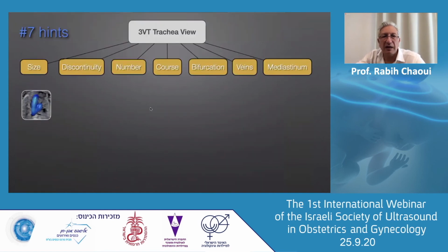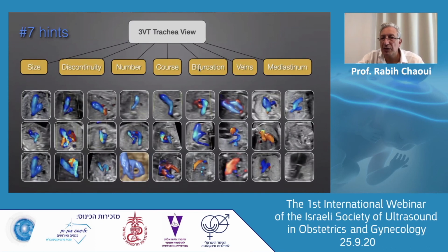So you see, I come to the end of my talk. I'm sorry that I was hurrying so much. I hope that it was okay with you. I hope to have shown you how to look at the size, the discontinuity of the vessels, the number, the course, the bifurcation, and the veins and the mediastinum. And within one view, you are able to see all these conditions I discussed with you before.